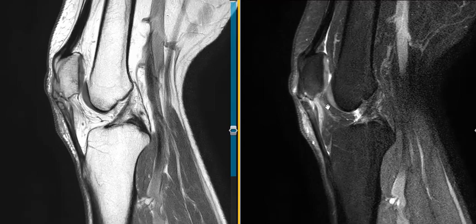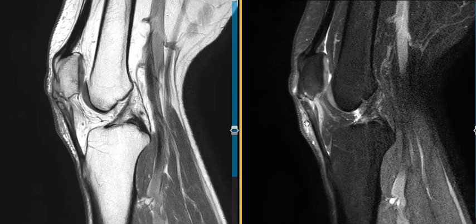So this is a case of patellar tendinopathy with prominent edema and inflammation and a little unfused ossification. Again, if we saw a young child with this during development, we call it Sinding-Larsen-Johansson Syndrome. And nowadays we call it jumper's knee, now that he's undergone skeletal maturity. And again, it probably started as Sinding-Larsen-Johansson Syndrome and just never went on to heal like it typically does. And that's it. Thank you very much.